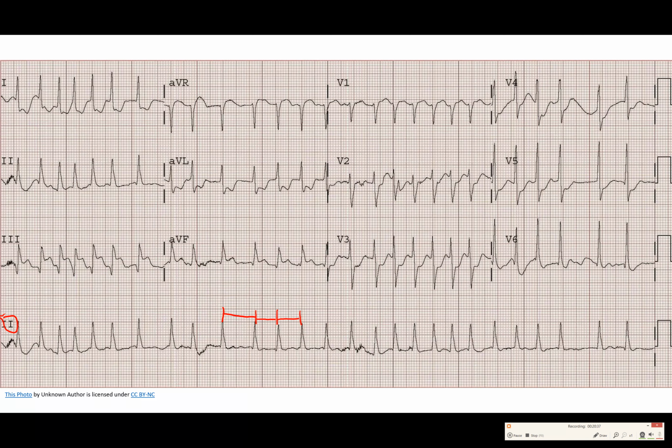In general, you're looking around saying, I don't think there are consistent P waves, right? No P wave, no P wave, no P wave. Most of them, you're sure, have no P wave. Occasionally, you might see a little bump, and you might question, is that a P wave? Let me just encourage you to put the words "in general" in front of the statement.